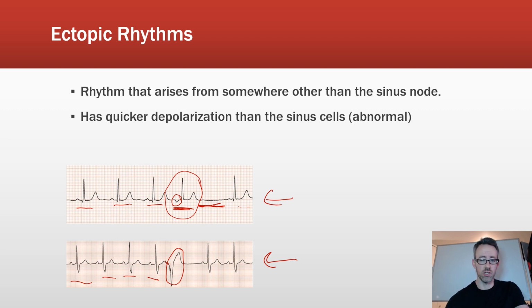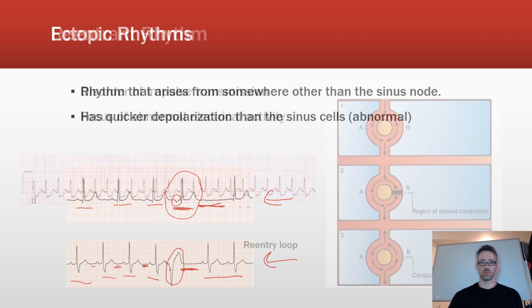It inserted itself almost immediately after the T wave there, whereas the complexes before had a little bit of a gap between them and a nice regular rhythm. But then this guy here just inserted himself right there, and that's an ectopic. So it's not an escape, it's just an ectopic beat. And you notice a little bit of a pause after the fact, and we resume normal activity.